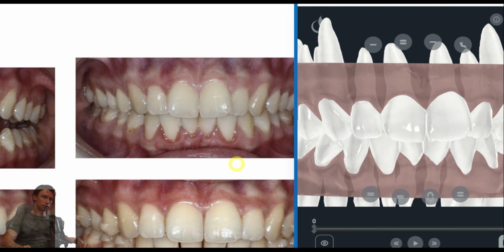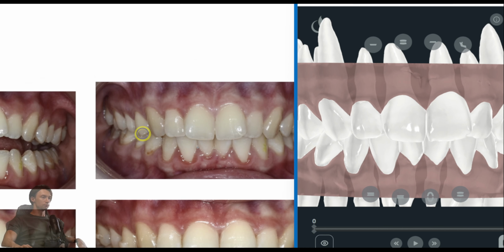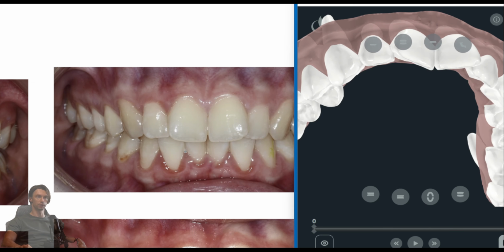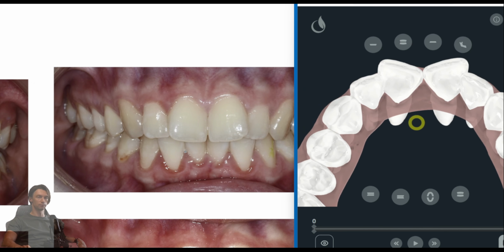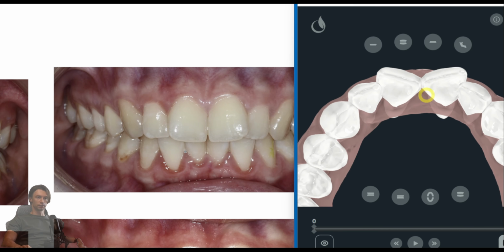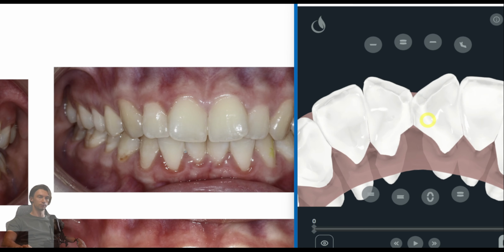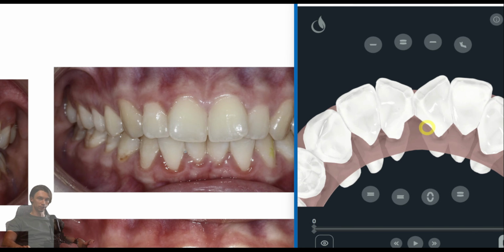I would like to present this clinical case as an example of using round tripping in order to achieve successful tooth rotation by a significantly large degree. We currently observe evident crowding in the upper arch. It is more convenient to view this in the right-hand window on the 3D model. We can see significant rotations of the upper and lower central incisors, especially here, as well as a space deficiency.